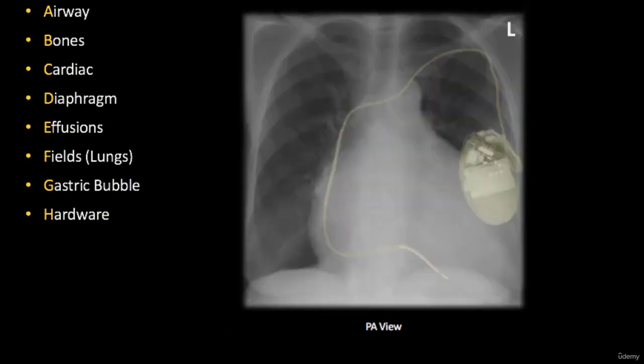If patients have any devices in their bodies, such as nasogastric tubes or electrostimulators, or EKG electrodes attached to the skin, of course, all these devices will appear on the X-ray too, and it will allow us to check whether they are installed correctly, whether they are in the right place or not. So this is one more point to focus our attention.